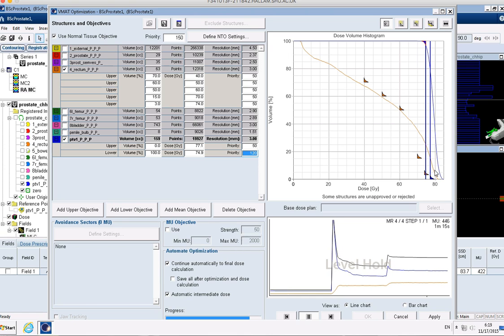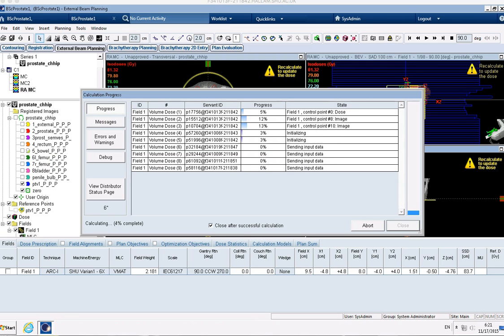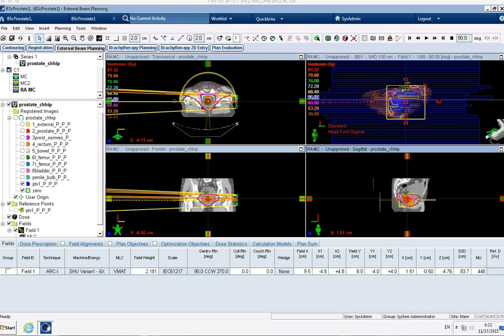So it's just coming to its final calculation for this run, so I'm just going to let it calculate and we'll have a look at the dose distribution. Okay, so I just paused it there when it was doing its final calculation, and now it's actually calculating the dose distribution. So the first section is where it calculates the fluence, and we'll talk about that in class, and the second part is where it calculates the sequences for the beams. So if we've not talked about this in class at this point, then give me a shout and I'll explain the differences between the two.